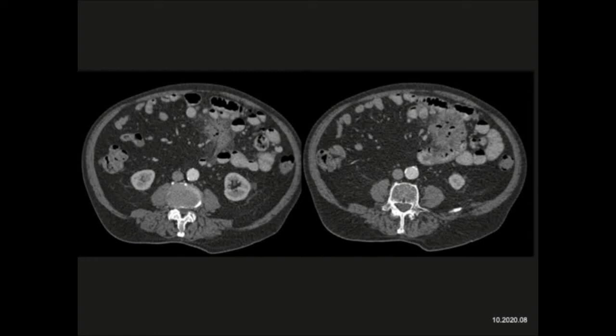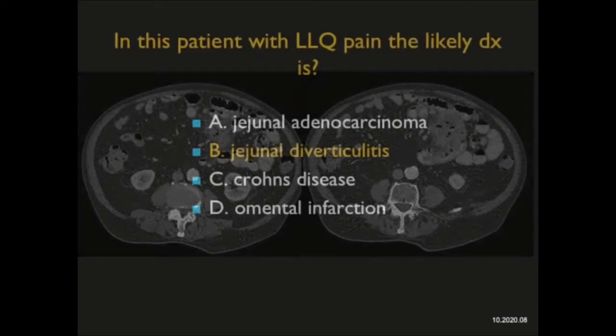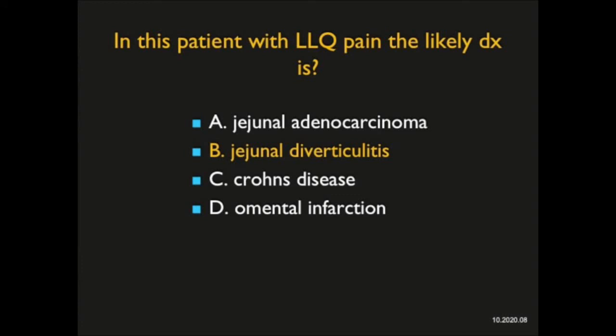We think about colon diverticular disease and diverticulitis commonly. We think about duodenal diverticuli, but we rarely think about jejunal or ileal diverticulitis. It's an uncommon process, but presents as an acute inflammatory process, and can be managed conservatively if you make the diagnosis. Obviously, it can be confused with a perforation of the colon. You could think about Crohn's disease or other inflammatory etiologies. Again, the mesenteric component is critical, but also the outpouchings of air, which at first you say maybe it's just free air. Then you realize you're dealing with diverticuli, and this was jejunal diverticulitis, a wonderful case.